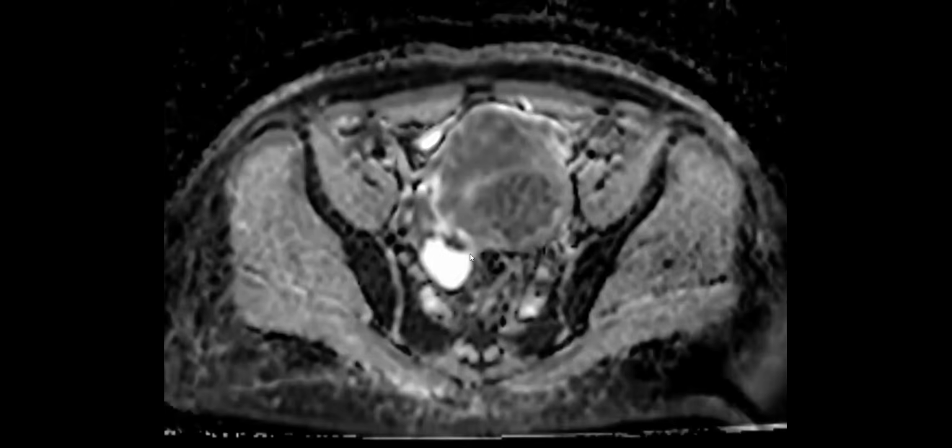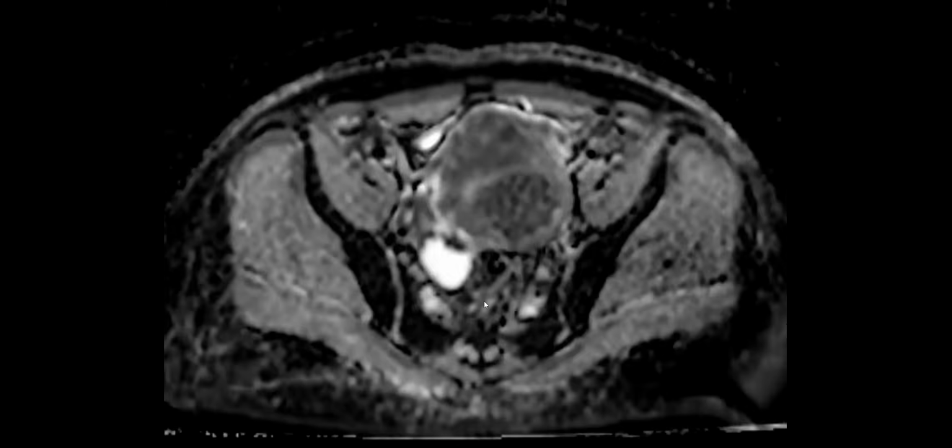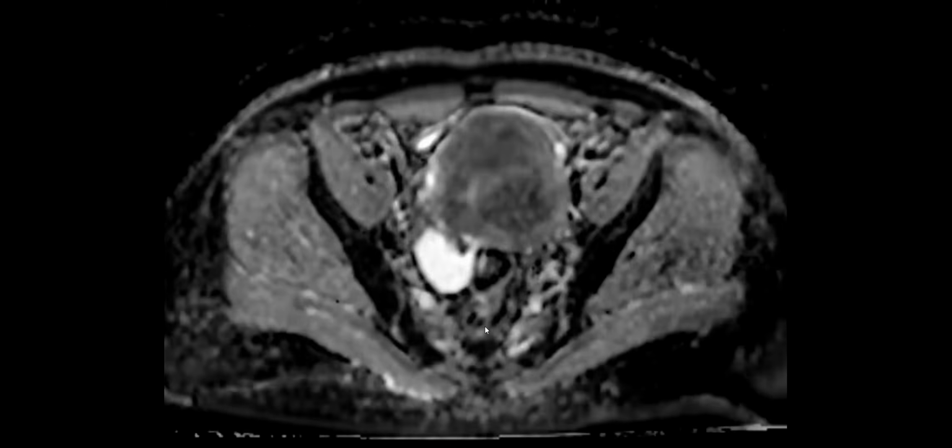I do want to show one more thing about my case, which is the thing that we found confusing. Even in that paper you just showed, there's this dark component, and that's the thing you see on fibromas too, where it's dark on DWI and ADC. In ours, the enhancing component was bright and then dark, so it didn't have that dark thing. So we wondered, could it be some variant of a malignant thing? Anyway, it didn't follow that exact rule. But overall, very fibrous, very T2 dark, and then very cystic. Always think about a cystadenofibroma.